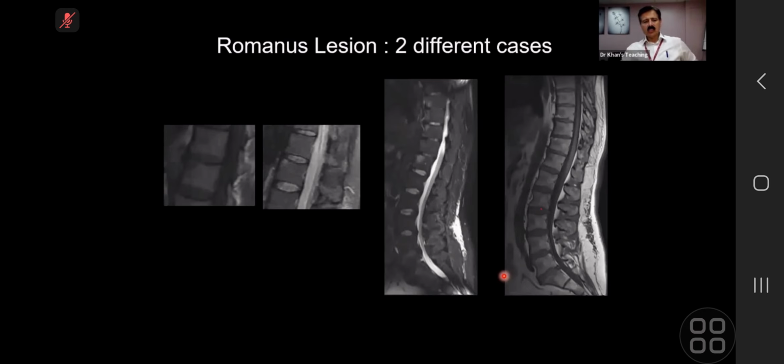Now on this film, candidate number 5, what is the take-home point?